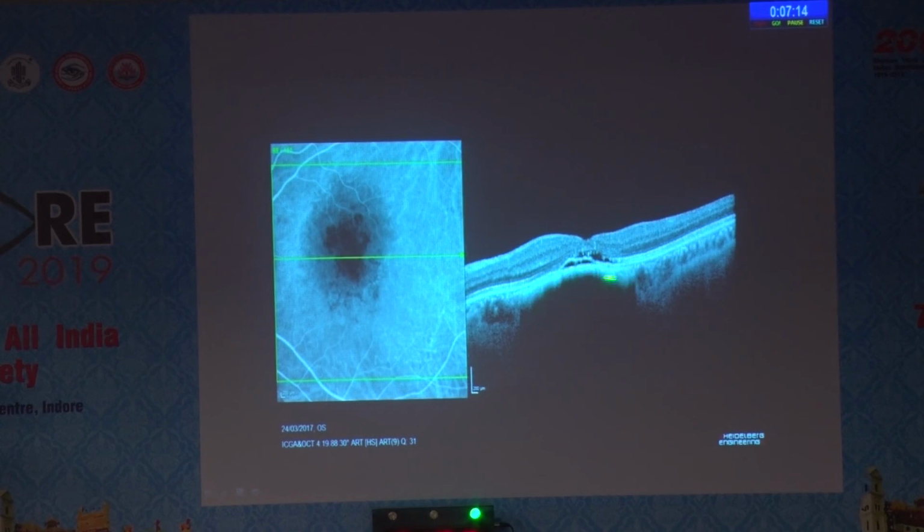One clue you can see here is that there is no lumen here. There is a very compressed stromal choroidal tissue. So everything is just stroma there now. There's no vascular lumina. Yeah, that's exactly what I was going to say. In OCTA, we see a neovascular process. See, OCTA is a generated image. How it generates it, we do not know.